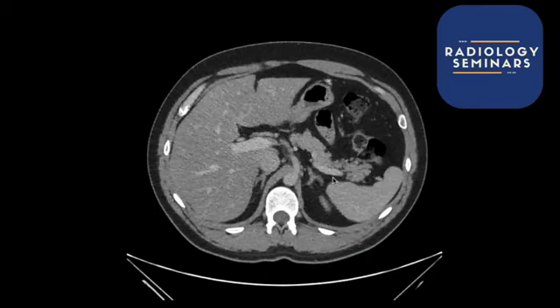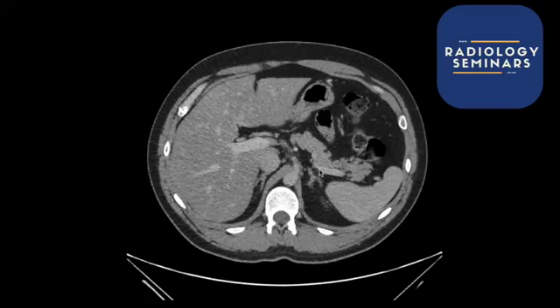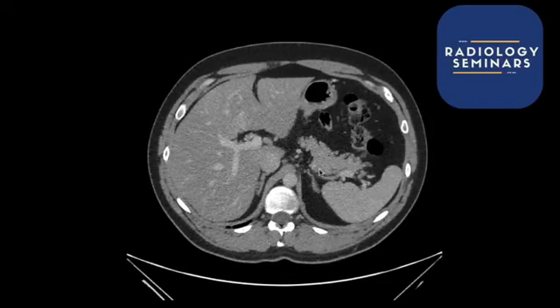So what can happen is that you can have inflammation of the pancreas. That sort of inflammation around the pancreas can start to cause inflammation of any of the surrounding structures, and that can actually result in thrombosis of this particular vessel over here. Some of you may have got it: that thrombosis of that vessel would be a splenic vein thrombosis.